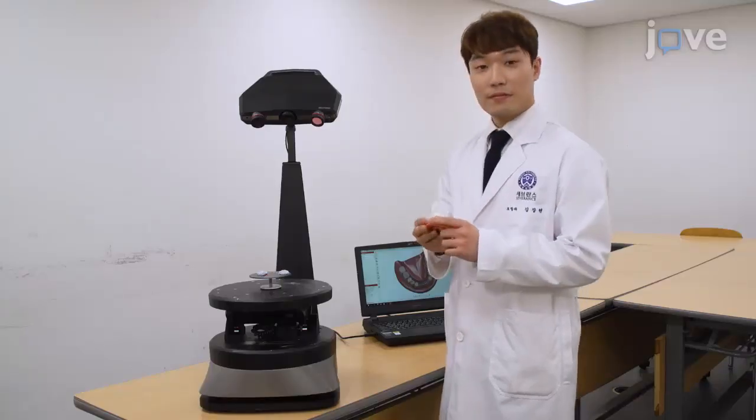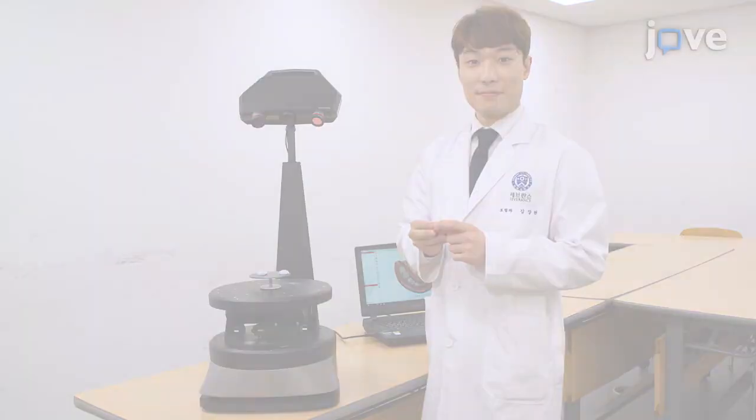A technique allows the analysis of distortion in the critical part of dental arch in the X, Y, and Z directions, which is an improvement over current methods using best fit alignment. Demonstrating the procedure will be Jang-hyun Kim, a technician from my laboratory.